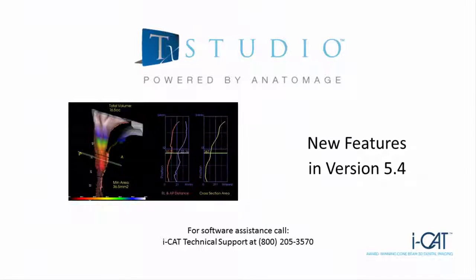Welcome to a presentation of the latest enhancements to TxSTUDIO. TxSTUDIO 5.4 features more powerful tools for complete implant, restorative planning and treatment, and airway analysis.